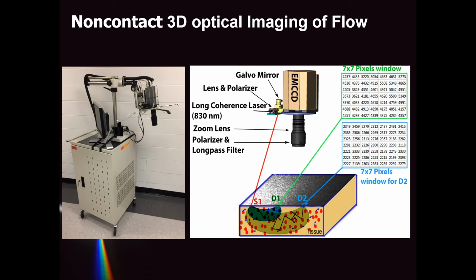And also there is a multiple-pixel window, which can be used to detect a spatial speckle contrast at different locations.